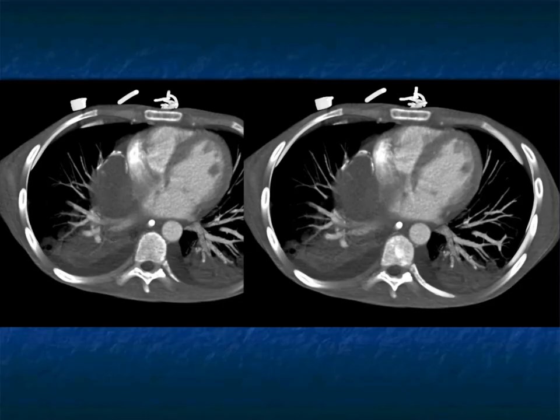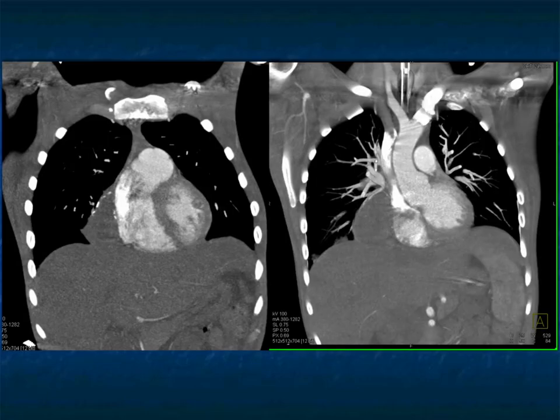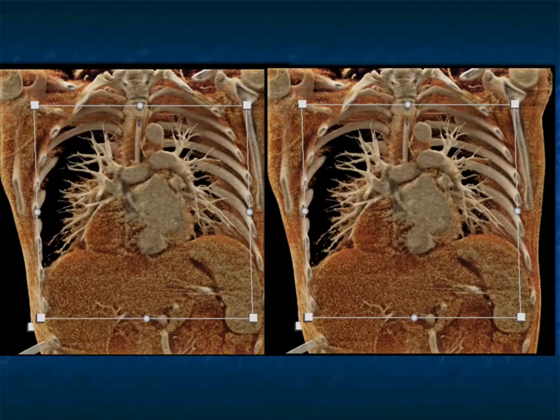You can see it on the volume rendered view, where you see the relationship between the heart and this lesion. So again, you're thinking about things like, even could it be a cardiac tumor, lymphoma, angiosarcoma? They're usually more invasive, but you at least think about that. But what could this be? Well, this was a great case, particularly as patient was really young, was a teenager. This was a thymoma, believe it or not.